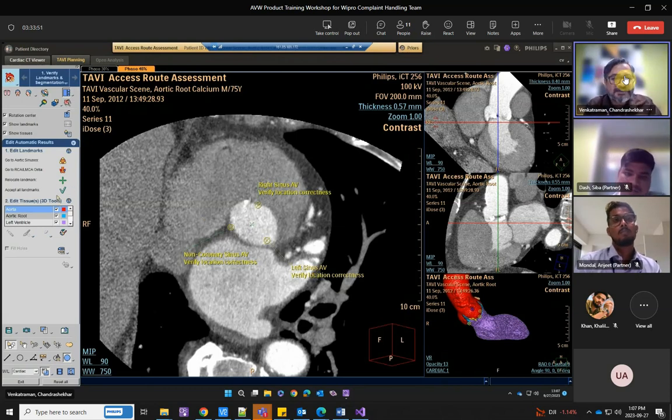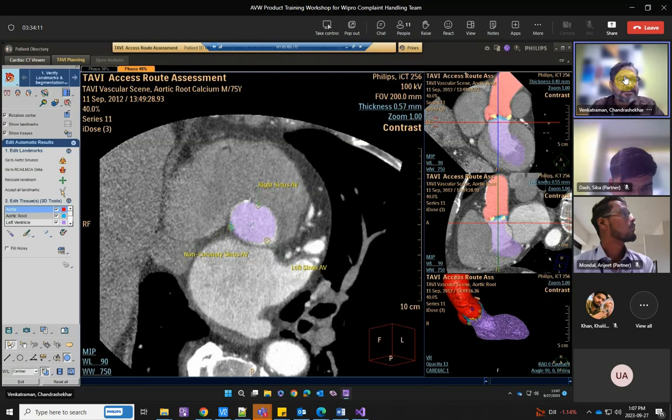So you can see that there are some landmarks over here, where the aortic valve is actually starting. Right sinus AV, non-coronary and left sinus AV, all these markings are there. You can just accept the landmarks, or even these tissues, whatever they are interested in. There are various tissues over here. So the segmentation stage, as usual, is a common thing.